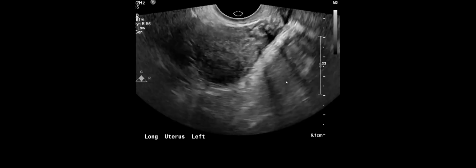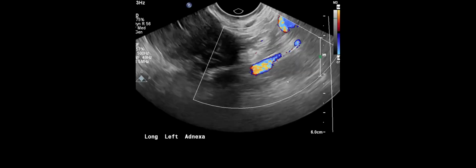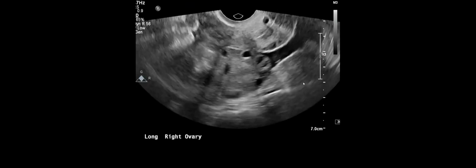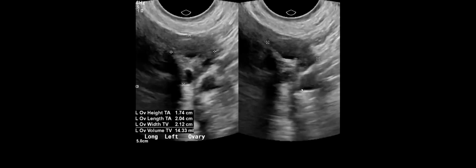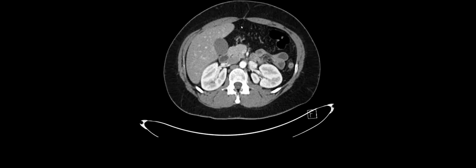The patient had pelvic pain. The uterus was pretty normal. This is the right ovary. It's really big, very edematous maybe. And this is the left ovary. Was there flow? Torsion? There was flow. Still torsion on the differential, with the asymmetry of the size. Exactly. So just based on size, we know that flow could be unpredictable or unreliable. This was the CT.